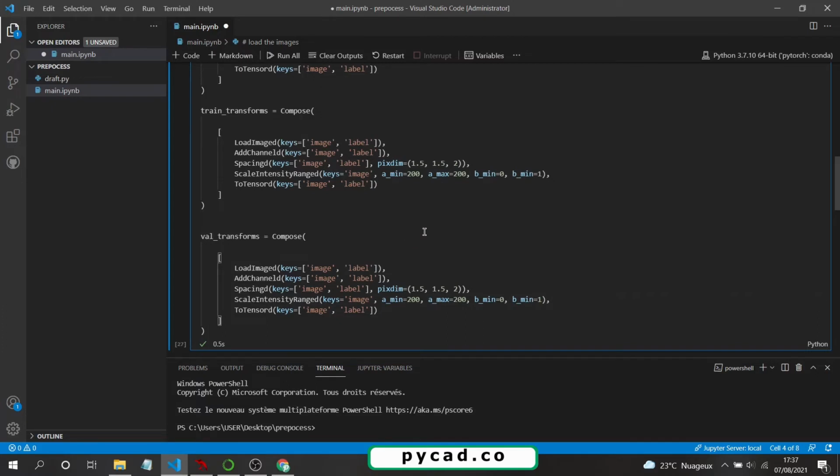Of course, there are maybe some things that you will need for the data augmentation, you can apply them only in the training, but we will not talk about them in this video. But here what we are doing is the pre-processing. So here you will ask what these values are. So I will answer you.